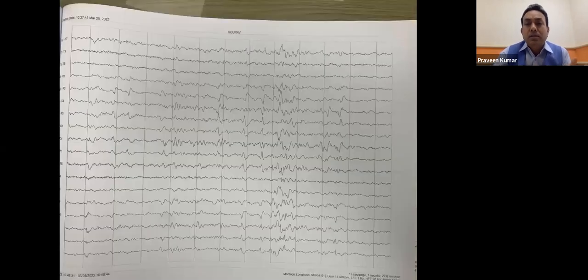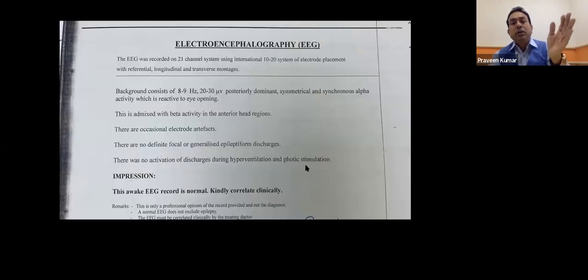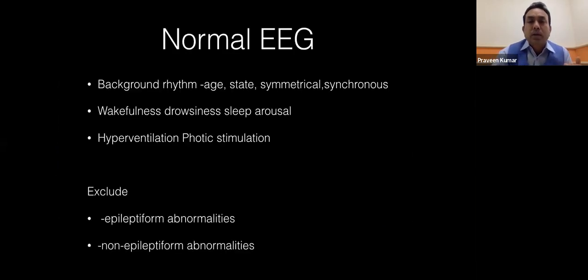Look at this small EEG graph. This is 1 second, 1 second. You can see maybe a couple of vertex waves here, because these are the waves, and this is their fundamental location. And you get the report and the impression in that sense. So that we'll discuss.